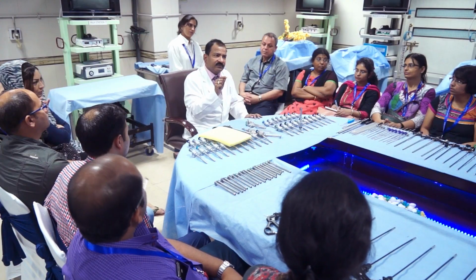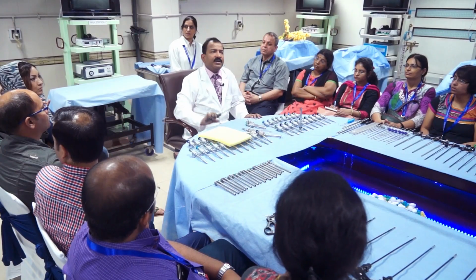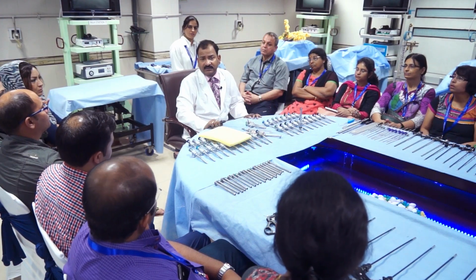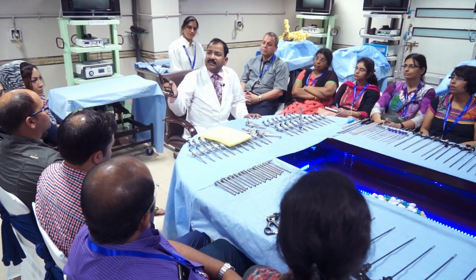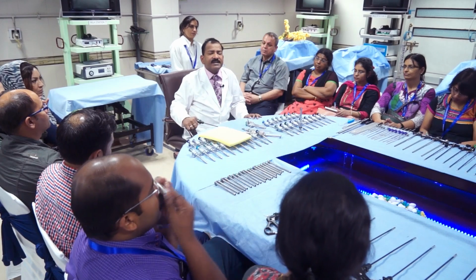Suppose this is a monitor and it is far away from me. Right now it is approximately 3 meters away from me. If I look at that monitor and perform the laparoscopy, then I cannot see the cystic duct, CBD, or uterine artery better. Do you know why?